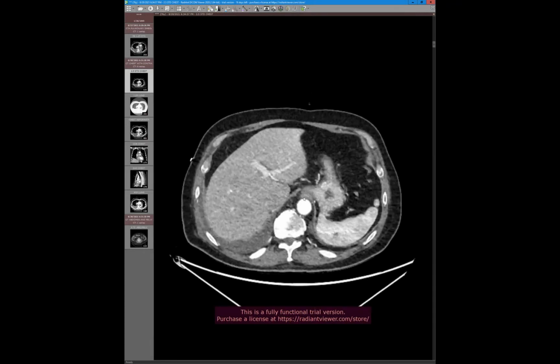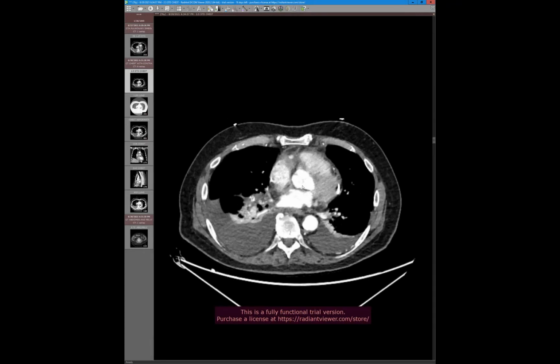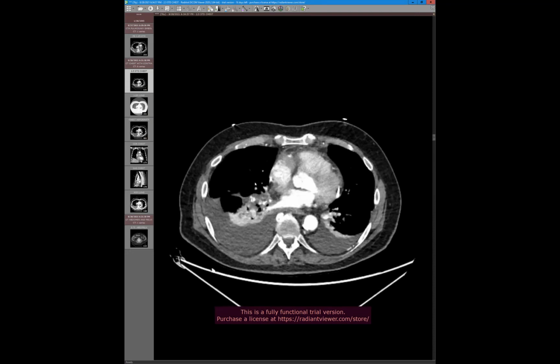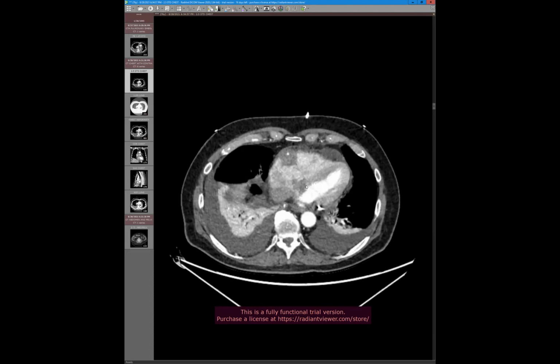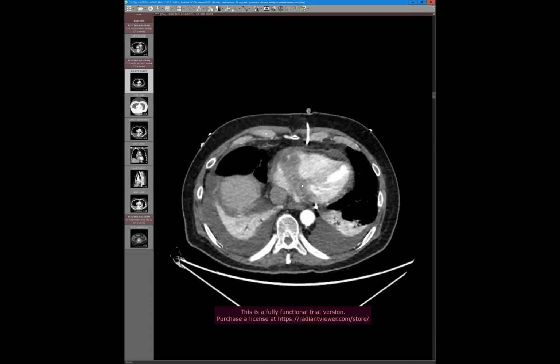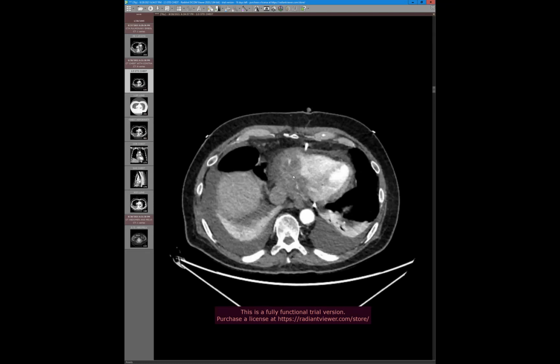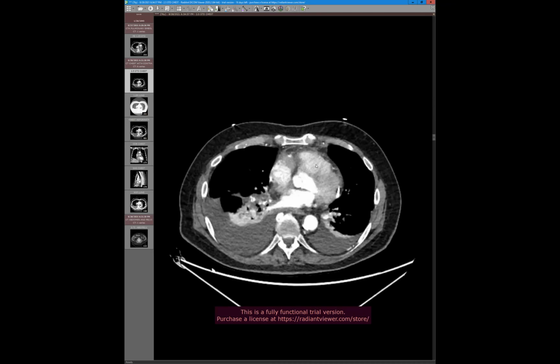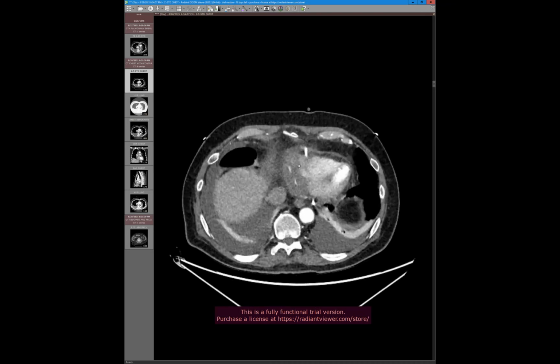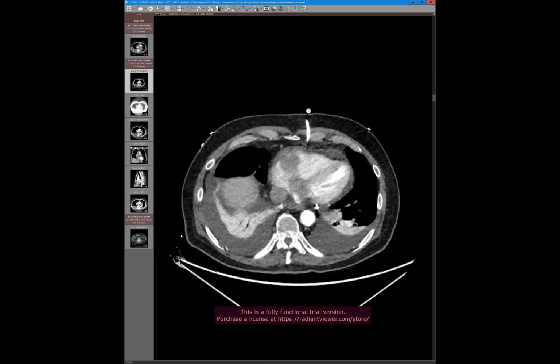So this patient was tapped, and then we have a CT that is after the pericardial effusion was tapped. They weren't aware about this lesion, and then they got a subsequent CT because they got a lot of blood out of the tap, and you can better see this infiltrative mass in the right atrioventricular groove, kind of wrapping around the inferior surface of the heart along the RCA, and then extending along the septum.